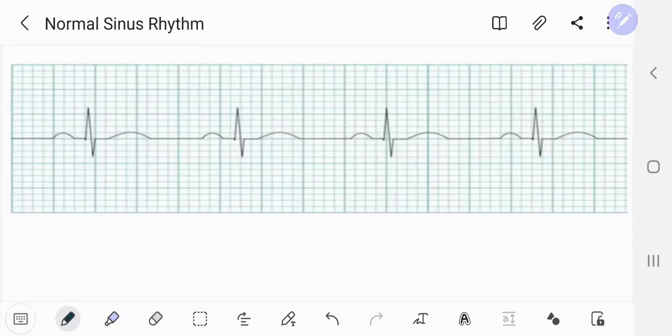Hello everyone. In this video we are going to discuss a normal sinus rhythm.